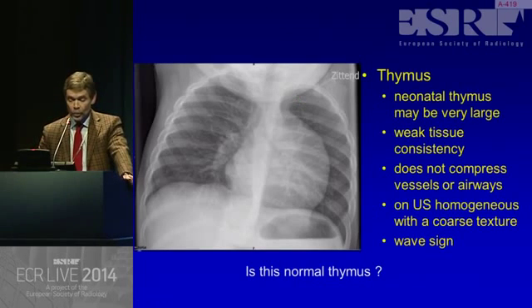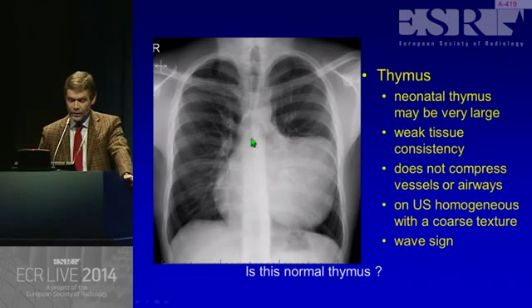So is this a normal thymus? I think so, because somewhere I see the wave sign. It's a very young child. So yes, this is thymus.